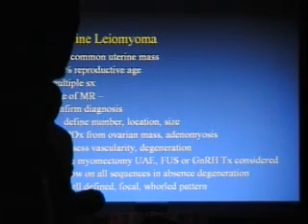First, confirm the diagnosis that we have fibroids. Then our job is to define the number, the location, and the size. So you go through an algorithm where you define exactly where each one is.